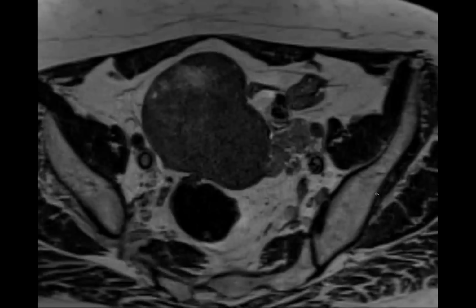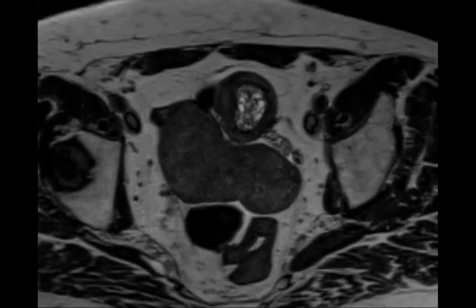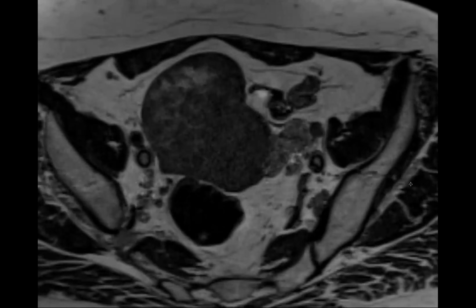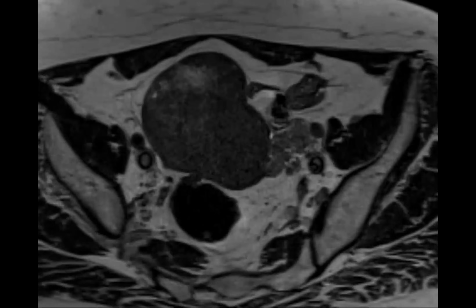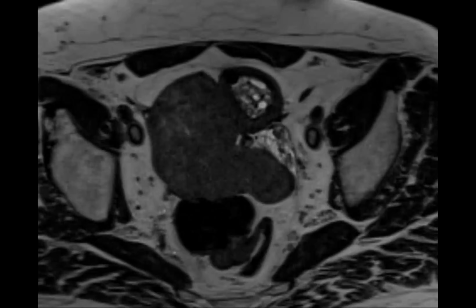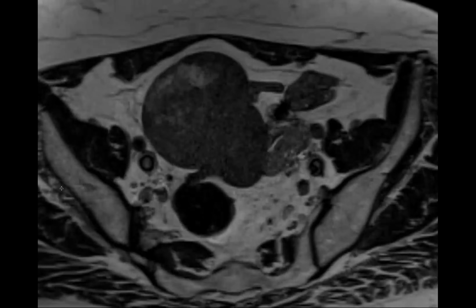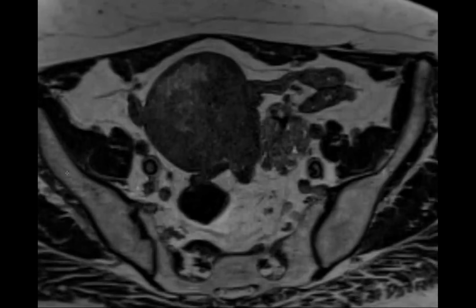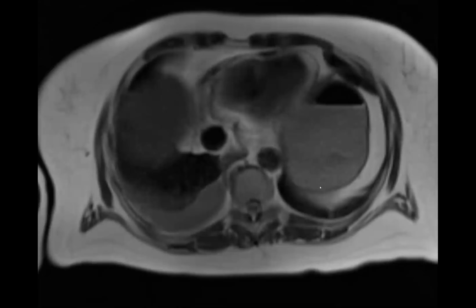Keep going. Go down all the way. But that's the uterus. Isn't that the uterus? Yep. And then something, it's like a torsed uterus. It's all torsed, all of it. It's torsed around some pedicle, and so the uterus, the ovary, everything, and then you have engorged vessels. Yes. Okay, perfect. Maybe that's the infundibulopelvic ligament. It's torsed around that thing.